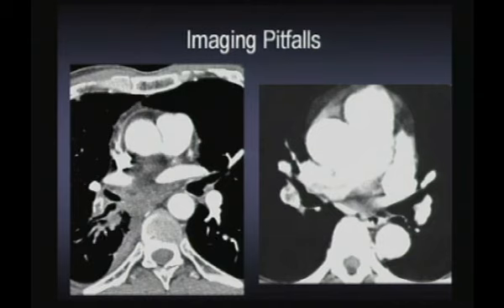Now, this is a relatively simple example, but unfortunately, occasionally you're presented with a case like this, and this is a totally intrapulmonary hemangiosarcoma, and unfortunately, this is a case where you really cannot make the diagnosis from the start unless for some reason you were suspicious and performed an MRI to evaluate enhancement within the embolic material.